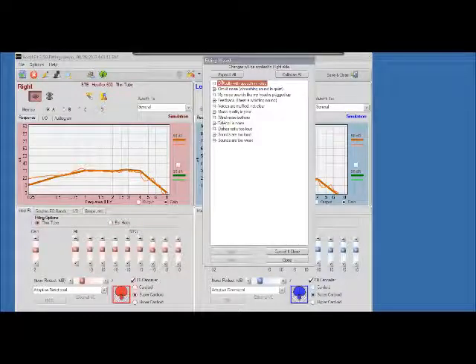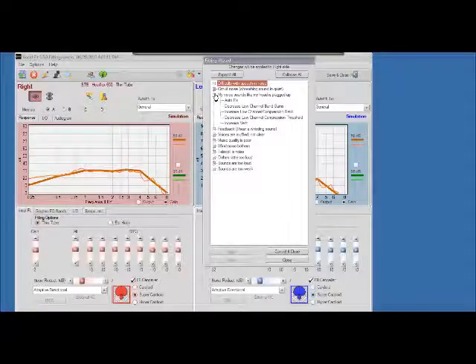So you have to decipher what your patient is saying and try and find the best option that's available here for you. Like the one here, my voice sounds like my head is plugged up. If I click the plus beside that, it drops down a number of options to take care of that problem.